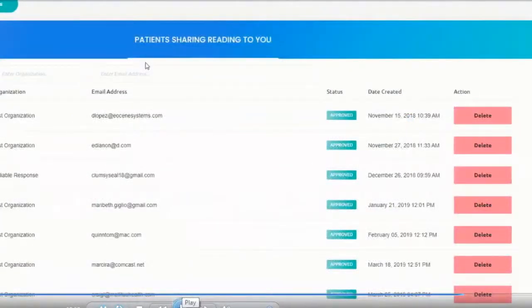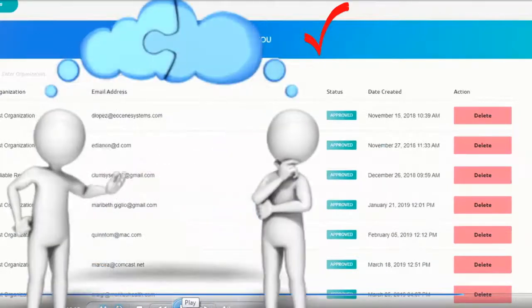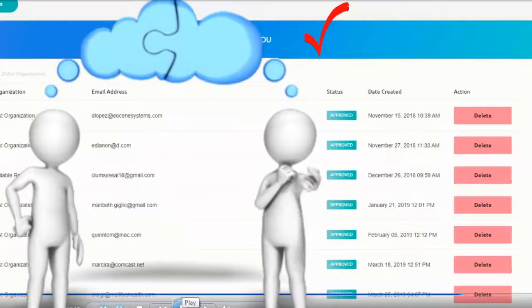In the healthcare team section, one doctor has the ability of sharing patient information with another doctor. For example, the patient's primary physician can invite the patient's endocrinologist to view the patient's data, and the endocrinologist can also bill separately for the monitoring time. The Smart Health platform enables 2 or more physicians' offices to view the same data and create separate notes that all can read.